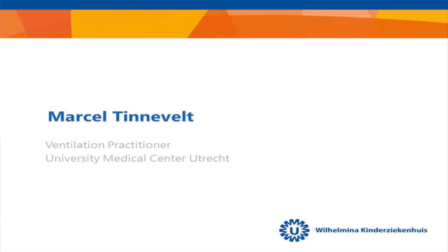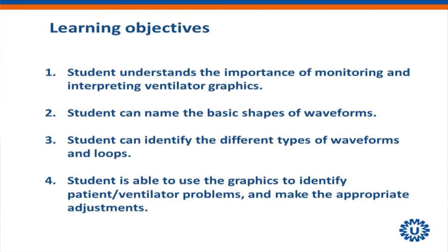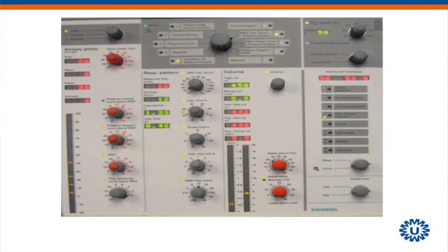What we are going to do in the next half hour is look at the importance of monitoring and interpreting the ventilator graphics. I want you to name the basic shape of the waveforms, and I want you to know how you can identify the different types of waveforms and loops. And as I told you, it was not so long ago that we used this one.